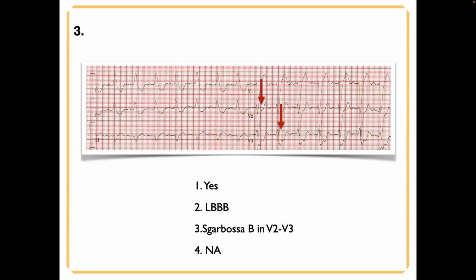Do you see V6? Yeah, I see what you're saying, like bunny ears on both sides of the isoelectric line? I don't have an answer on that one. Okay.